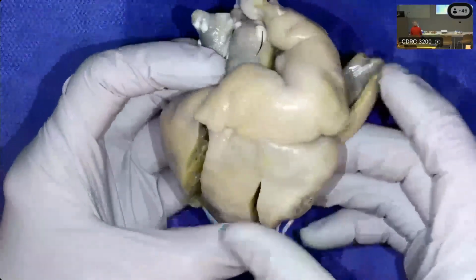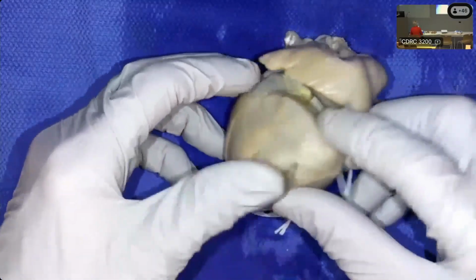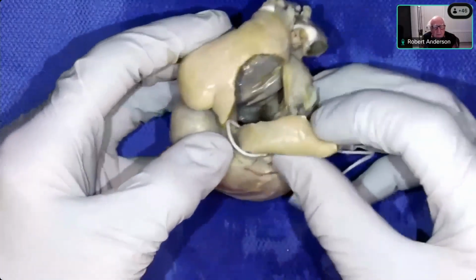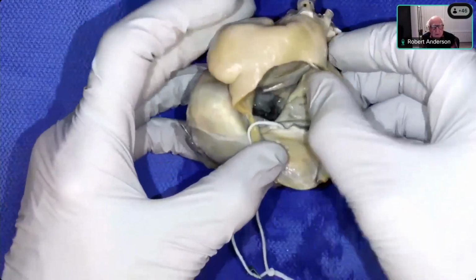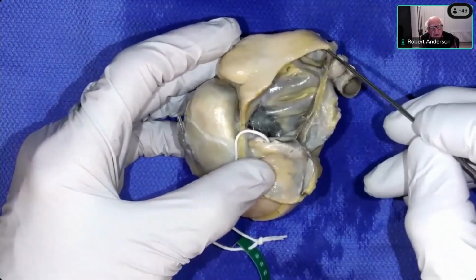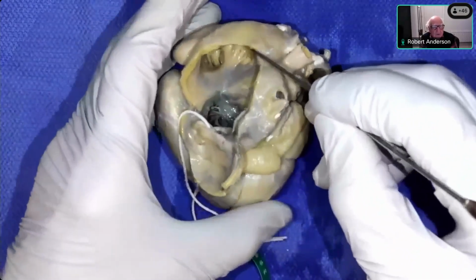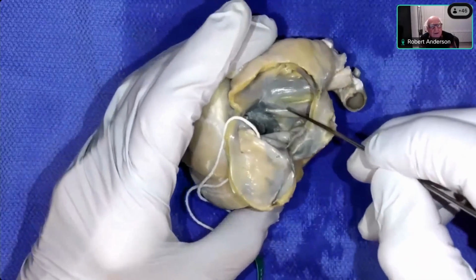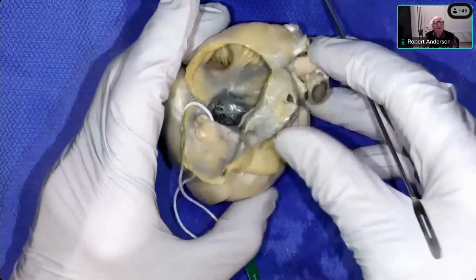We'll look at those ventricles now, so Diane, yes, just go back and show them again and flip that. Look how smooth, beautiful. Now you see that smooth vestibule. Yes. And that is the giveaway that we're dealing there with left isomerism. You look down and look at that smooth vestibule, and now look at that narrow neck of the appendage. That's beautiful. Yeah.